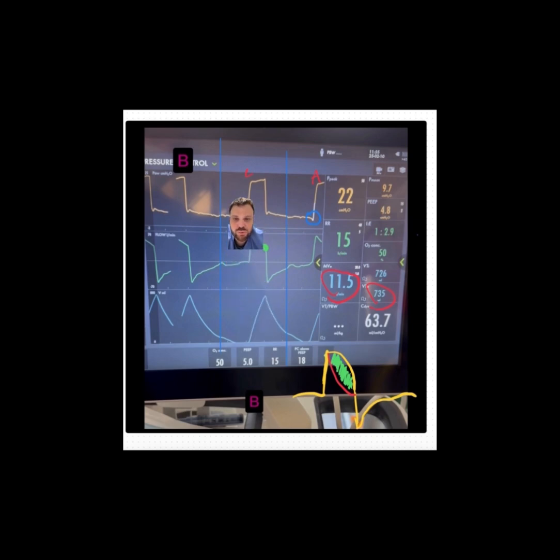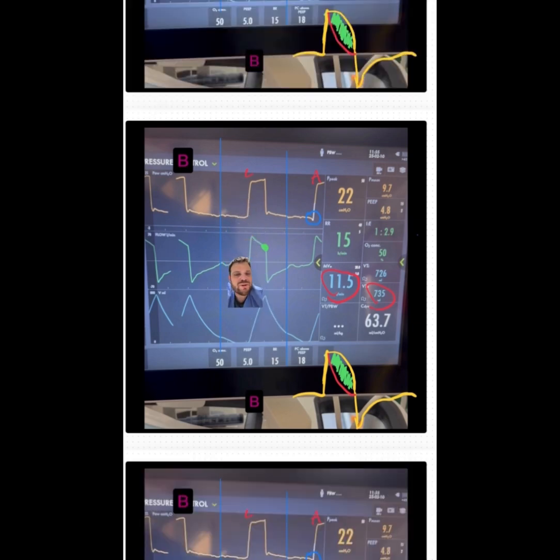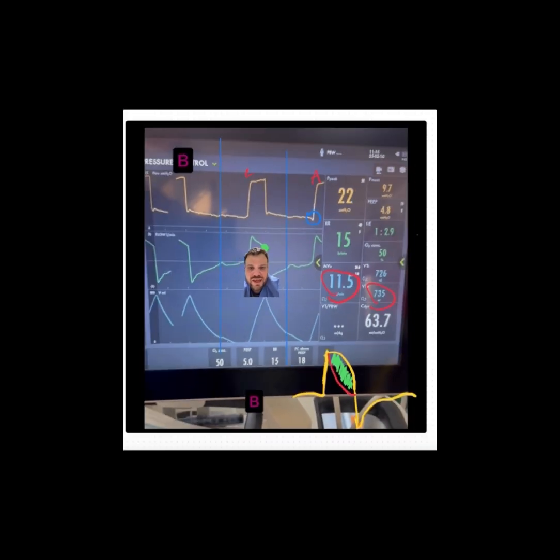20s because even on these controlled breaths that I think are maybe not totally passive, but pretty close to passive, you notice that at end inspiration, you're not at a flow of zero, right? Meaning that since there's still flow, there's probably still a pressure gradient, meaning the alveolar pressure has to be less than our set or peak airway pressure. And I have these blue lines drawn down. They may or may not signify ineffective trigger, which could also signify auto PEEP.